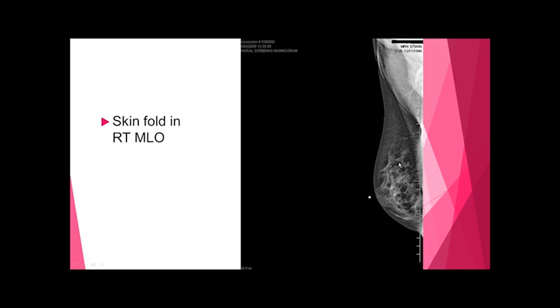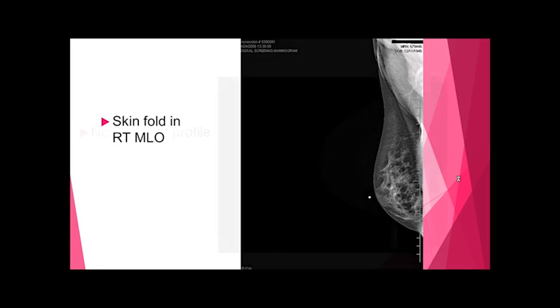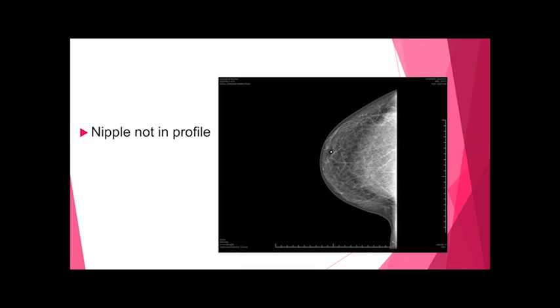This patient is very, very thin, so your angle needs to be higher, like steeper, 55 degrees or so, to be able to accommodate. We know that the angle depends on body habitus. The shorter, the heavier the patient is, you want to use less angle, like 35. And then the taller, the thinner the patient is, you want to use a steeper angle, like up to 55 or 60.